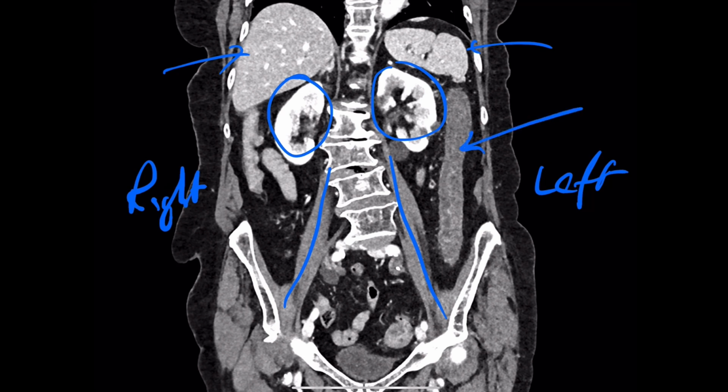And this long structure in the left abdomen is colon. And why is it abnormal? It's abnormal because if I were to pick a little bit of more normal looking bowel here, it's sort of thin walled. You can see straight away that this looks thickened, edematous, inflamed looking. And to a gastroenterologist, that will start to ring alarm bells, because I'll start to go, is there inappropriate excessive inflammation here? Absolutely. So radiologically, this looks like a colitis. And I'd be recommending as a radiologist that this patient have an urgent colonoscopy to figure out why.